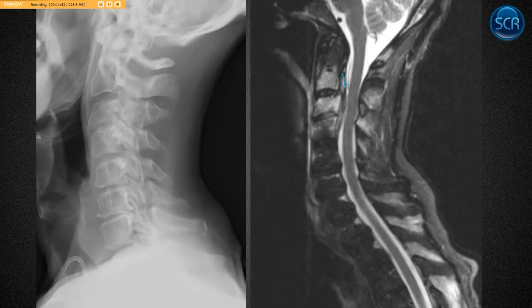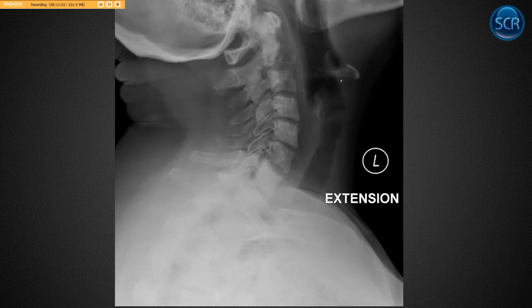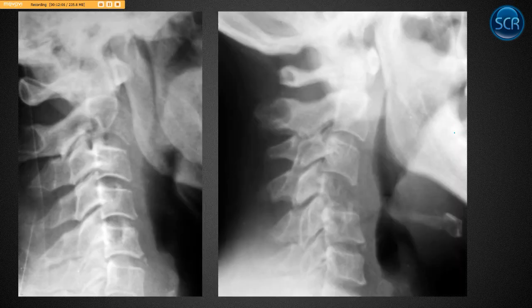But you can see the epidural collection looks similar, right? So we have posterior extension of this mass compressing the upper cervical spinal cord. So this, I think, was a breast cancer. This one is quite a bit more obvious, mixed lytic blastic. We can see a few sclerotic changes with other lytic changes. We lost the anterior C2 vertebral body here, another bunch of ivory vertebra. So this is prostate cancer mets, I believe.